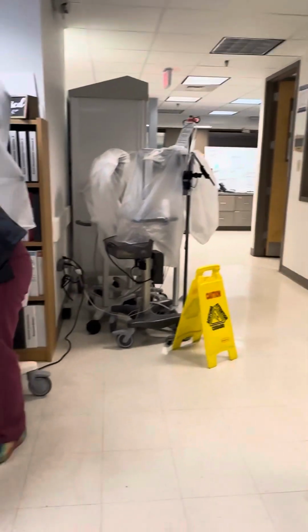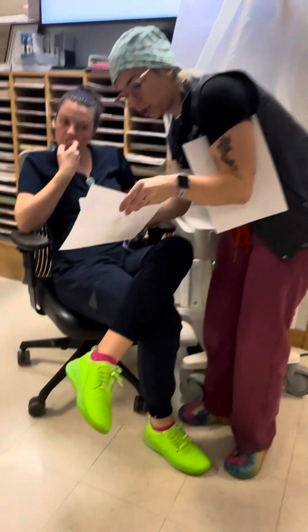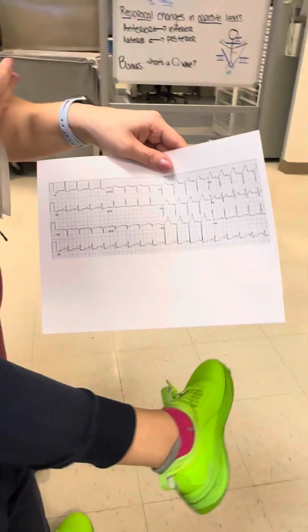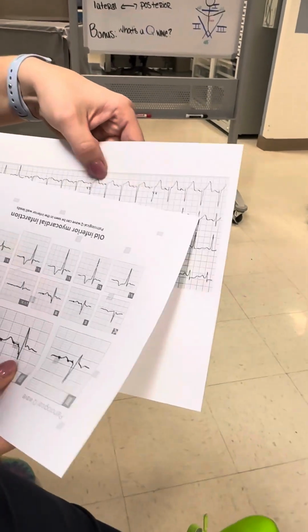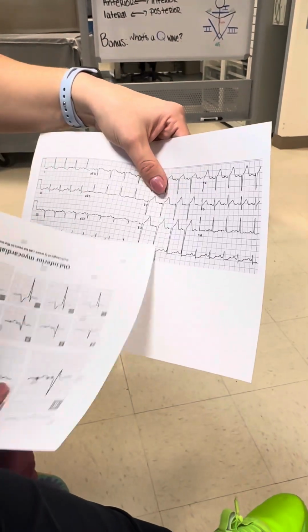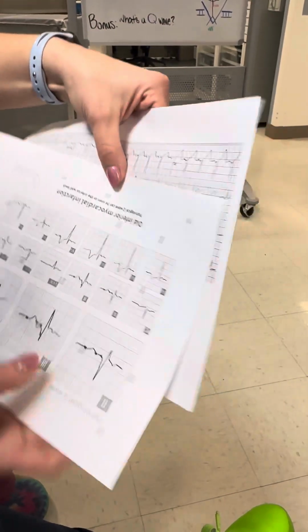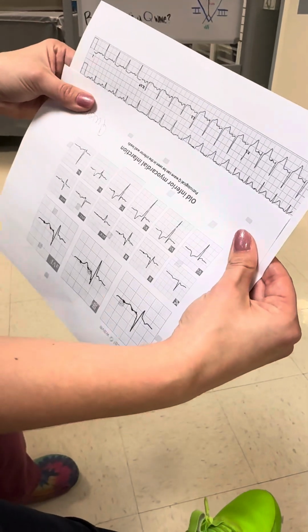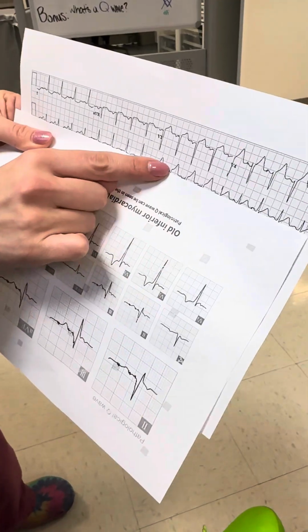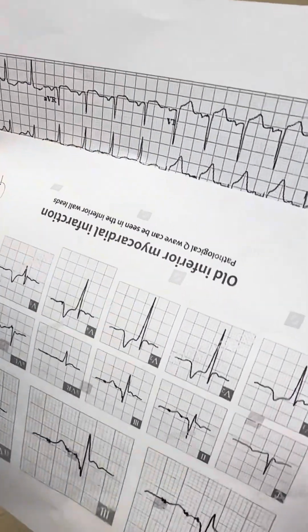So when I'm talking about this isoelectric line, you want to look at the part where it all comes back to on V1. Sometimes it's easier with a literal piece of paper. Or you can just look for wherever is flat. You can see how this flattens out in between there. So that's your isoelectric line. See how it lines up like that? Your P's take off from there, your Q's take off from there. Do you see how my T wave isn't taking off from that isoelectric line? So that's the elevation right there.